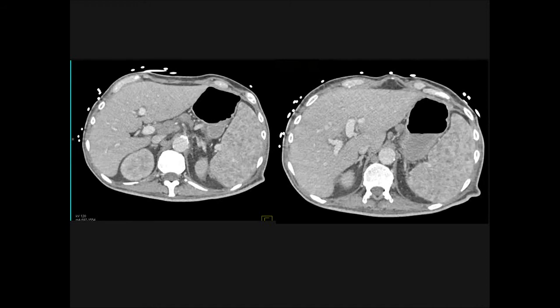I guess it could be sarcoidosis. Multiple low-density lesions are indeed possible. It could be lymphoma, and in fact this is lymphoma, primary splenic lymphoma. You do see in this case the patient does have nodes in the portal caval space, and you can see nodes with sarcoidosis as well. Both sarcoid and lymphoma can give you involvement of both liver and spleen.